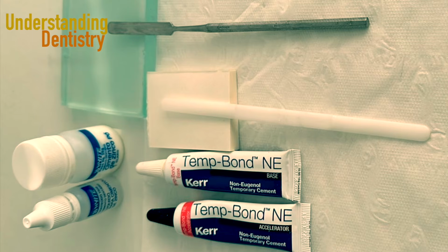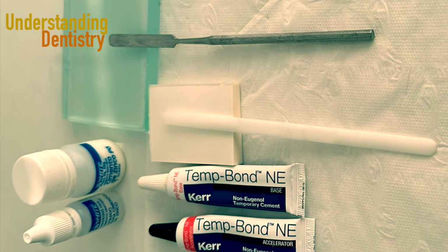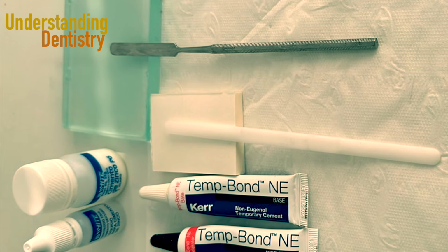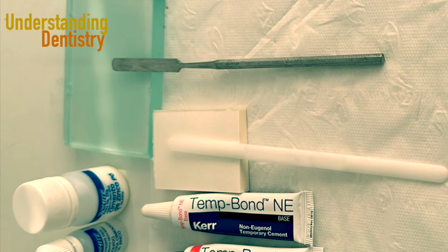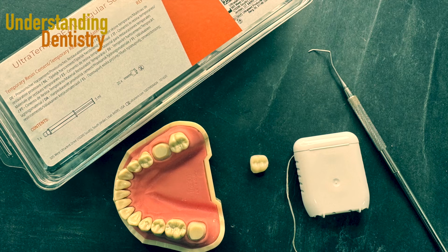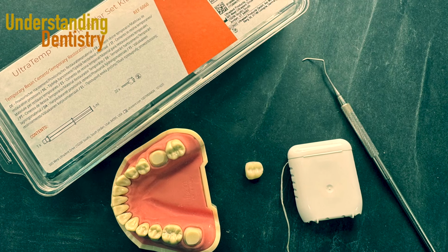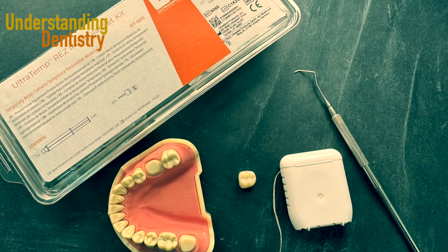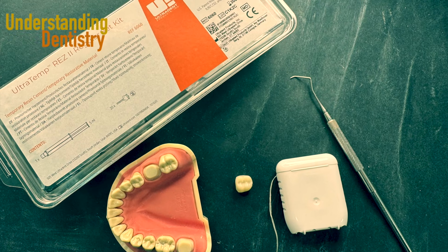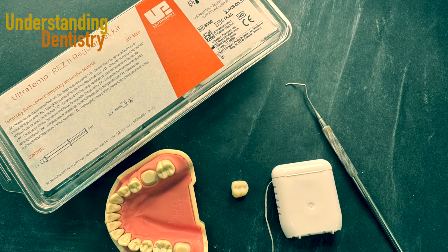So we use the retraction cords, to be packed using these metallic instruments of the same kit from Ultradent. Now, for temporary cementation, you can use those materials with mixing pads or glass plates and spatula, all right? So that's zinc phosphate, and the other one is a non-eugenol cement. Or you can use this material from Ultradent, the Ultratemp, which doesn't require a glass plate and cement spatula, all right? Because it mixes in the same syringe. So we can also add the video showing this procedure.